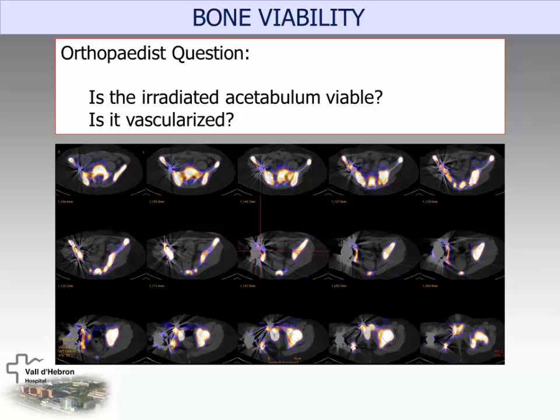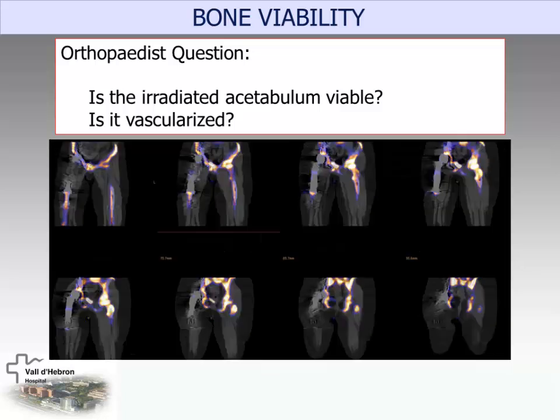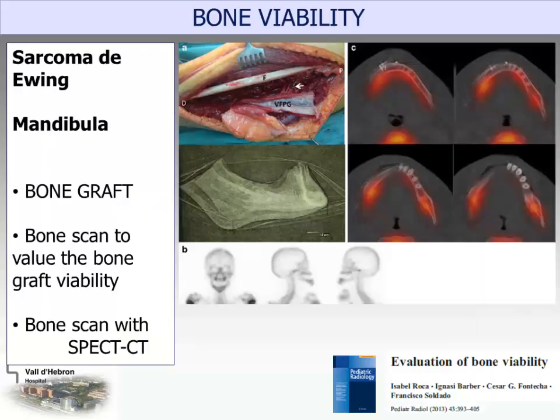And that means that they did the things very well, and they vascularized this graft very well. Okay. On the coronal images, we can see also very well the uptake. In fact, with a little bit of displacement of the graft, of the femoral head, but well, this is not important.